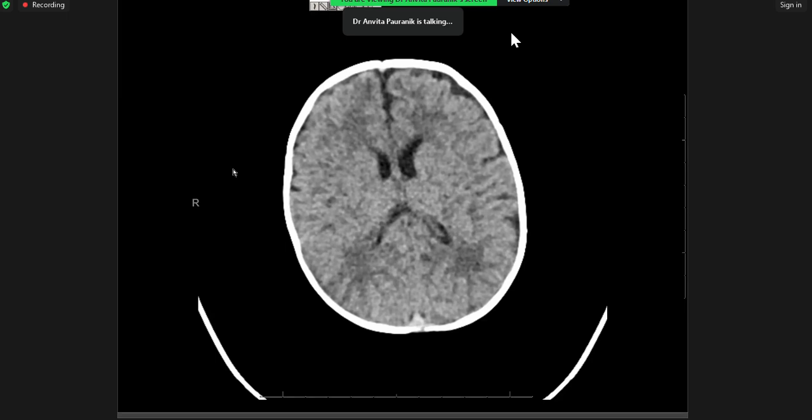Somebody has written myelin fat. It should be more dark than non-myelination. Yeah, so that's the thing. If you look at the Hounsfield units, this will be different from the MR signal, right? So you can just look up the different Hounsfield units, and water is low density.